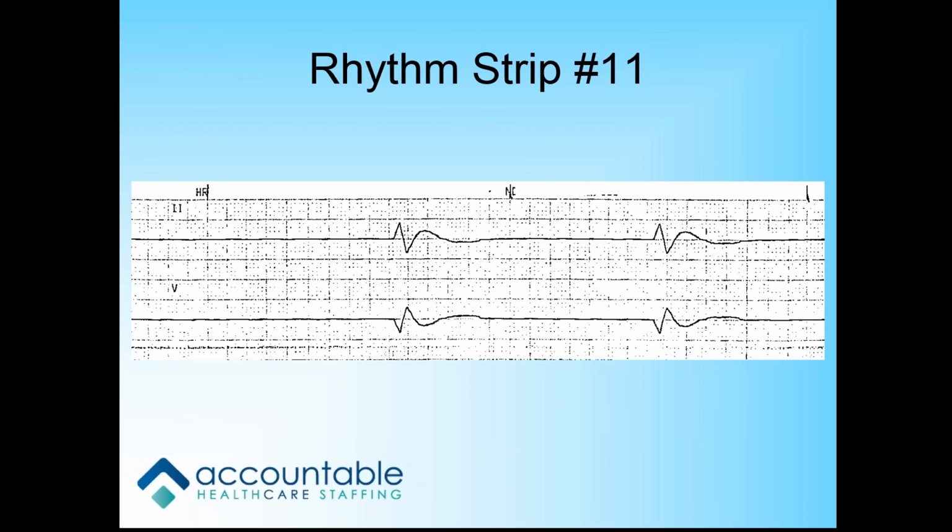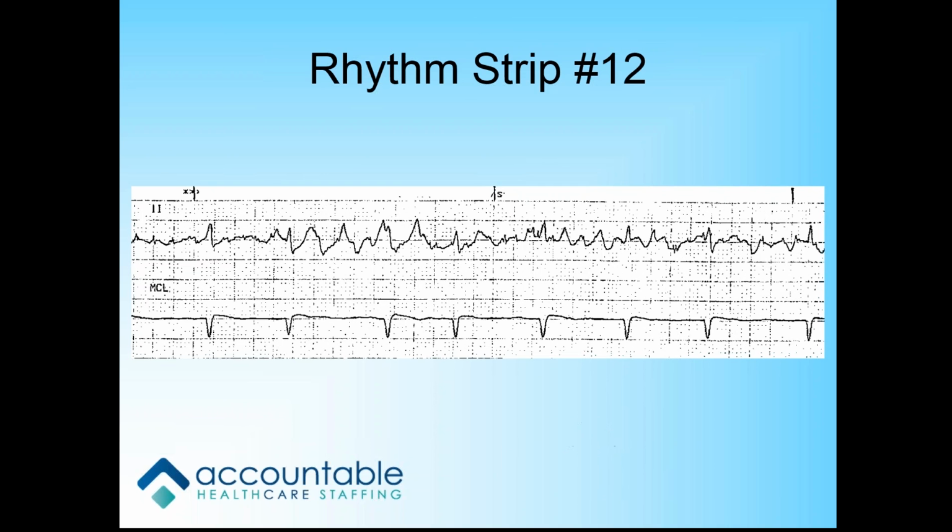Okay, next. So Irene, what are we going to do for this patient? You give epinephrine. You could, but you know that you're going to try to pace that person and see if you've got anything to capture, right? Okay. Because you didn't have anything much left to capture, but you could try it. And you can try epi. Okay. Thank you, Irene. Thank you. Jess?